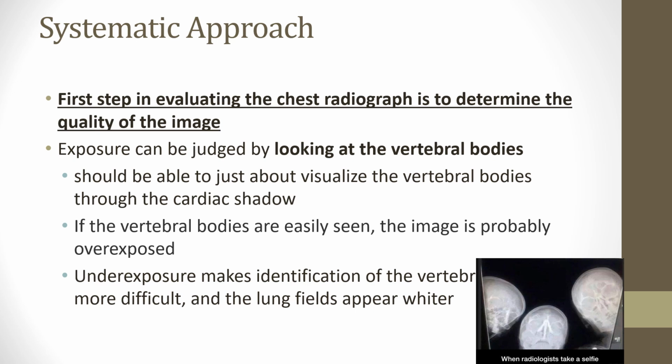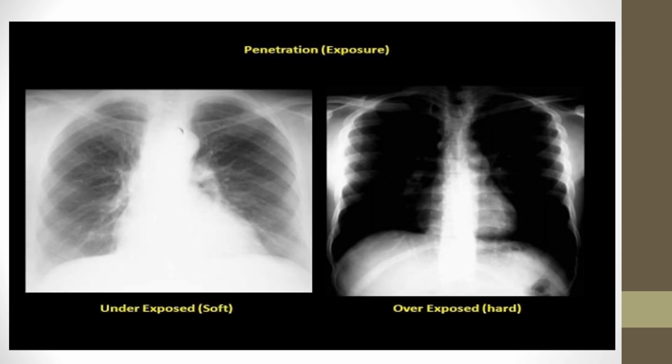So when you look at the X-ray, you have to ask, hey, what's the quality of this film before you start making changes? Here's an example of overexposed versus underexposed.